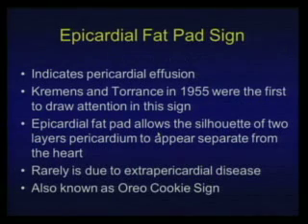Epicardial Fat Pad Sign was described in cases of pericardial effusion and was described in 1955. And at that time was named Epicardial Fat Pad, but today we know this sign as Oreo cookie sign.